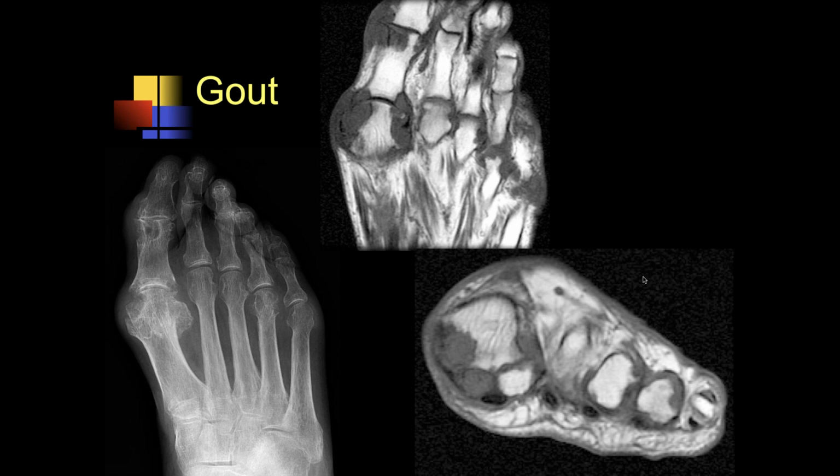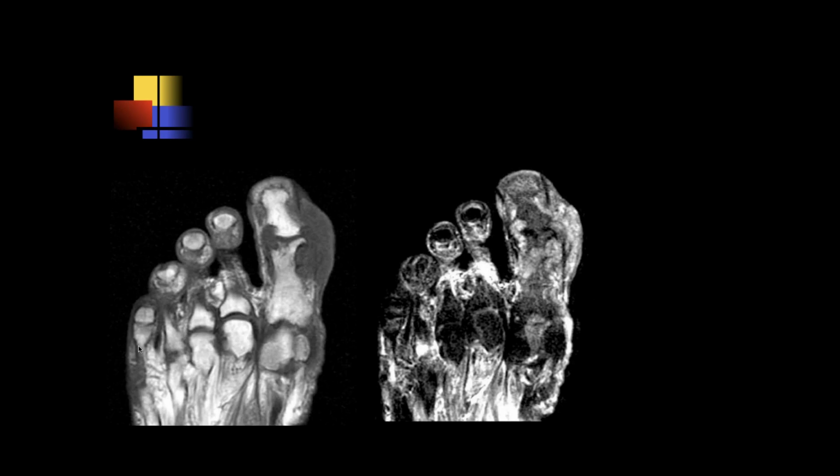Okay. Yeah, and you can see all this soft tissue thickening here with relatively sharp margins. The one thing with gout, if you have an acute disease with rheumatoid arthritis, the margins are usually indistinct because you've got a lot of osteitis associated with them. With gout, the margins tend to be very sharp, and you get these sharp spicules that you're all familiar with, which is very characteristic of gout. Other inflammatory diseases dissolve the bone, and you don't have these sharp prominences. With gout, you get these sharp little spicules of bone that you really don't get in anything else. Kind of sharp margins. So this is gout.